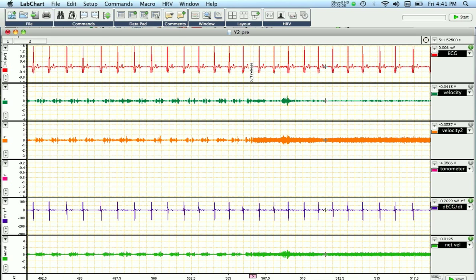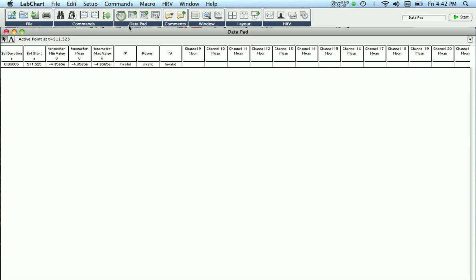What you're going to do is run one macro. This particular macro highlights 0.1 second time intervals and then subsequently moves 0.1 seconds across this whole signal for 120 seconds. Every time it highlights 0.1 seconds of time, it dumps information into your data pad. Specifically, what we need is the frequency power and the power of the signal, as well as the start.